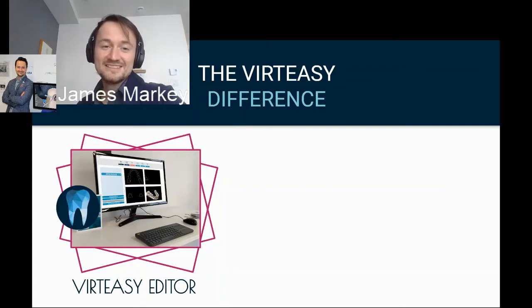And very quickly, the difference with Virteasy compared to all the other simulators out there: the majority of them only allow you to import an STL from an intraoral scan, and that gives you a single density. What that means is that the simulation will be very similar to doing a treatment on a phantom head with a plastic tooth, just a single density as you drill through it.